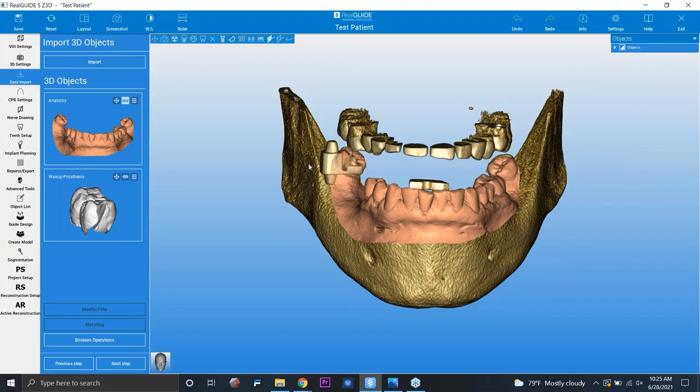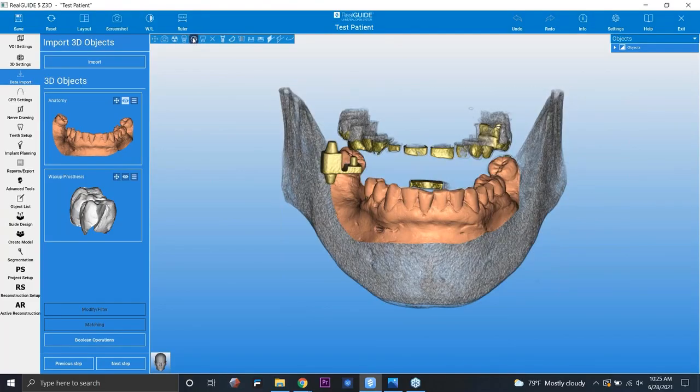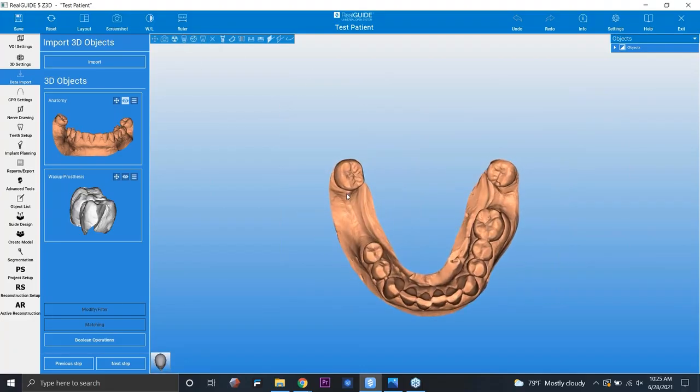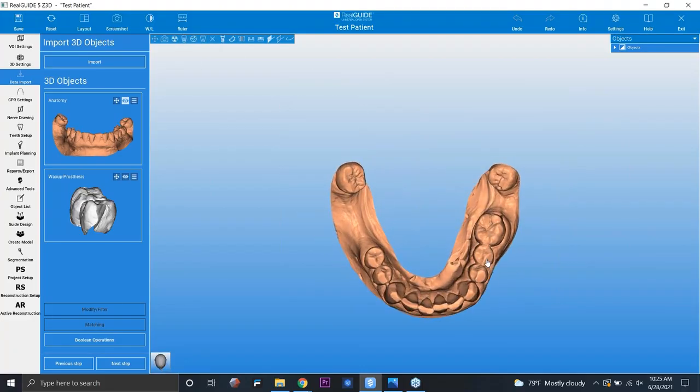position. So now at this point, I can actually go ahead and turn off the 3D and do all of my planning and work directly off the model now that I trust its positioning. So up here is our kind of quick visualization shortcut. So you can see that I can quickly toggle between those templates from earlier, but I can also turn off the 3D completely. And as I mentioned, just work off of this model.